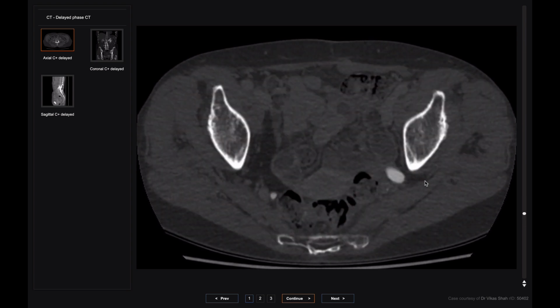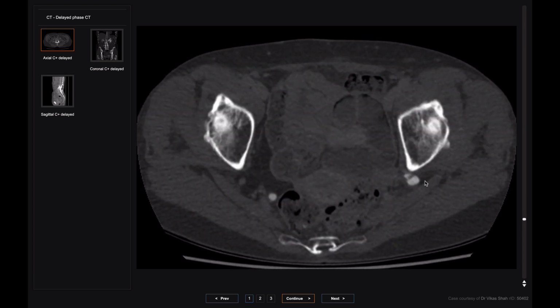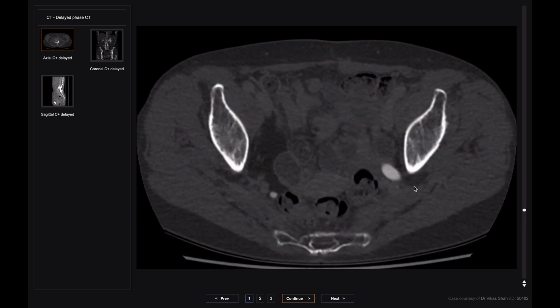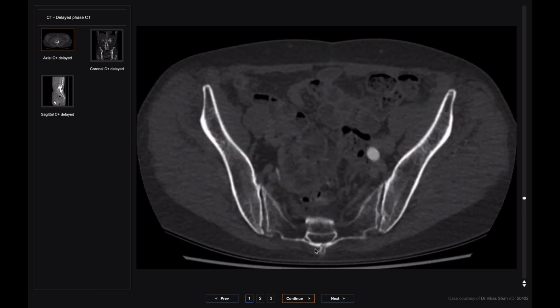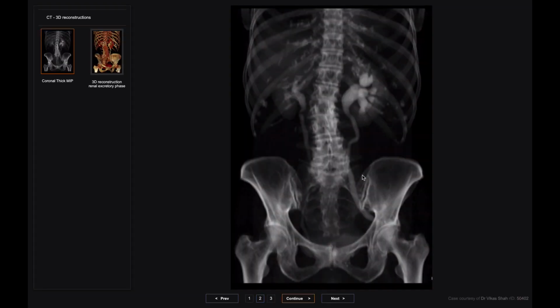And so this is a hernia, a quite uncommon hernia, sciatic hernia, where the ureter is trapped within this tissue space. And that's why there's upstream obstruction of the ureter. And just like we saw with the arterial phase study, this data can be manipulated to present it in different ways. So here, this looks like a virtual old-fashioned urogram that we used to do, where you can see the path of that very distended ureter.